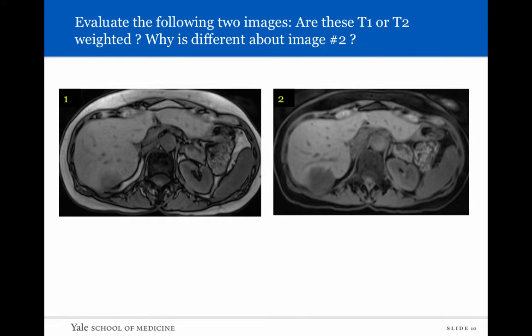How about these two images? Are they T1 or T2 weighted? What is different about image number 2?